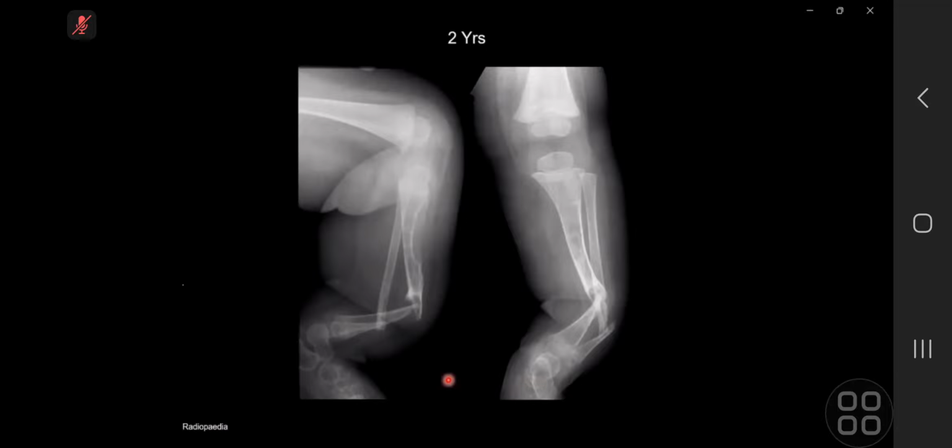I'm trying to look for soft tissue nodules seen throughout the soft tissues. On closer inspection, I can see there are a few soft tissue. No, not here. So don't worry. There is nothing in the soft tissues in this case. This particular entity, how do you describe it? What happens in neurofibromatosis? I've confirmed your diagnosis is correct, but you tell me why.